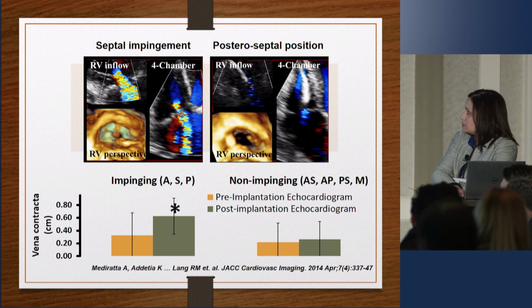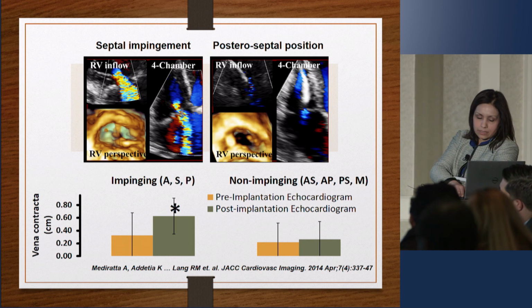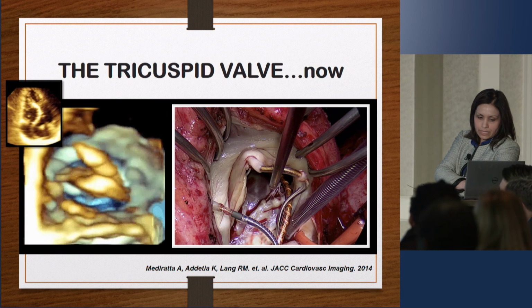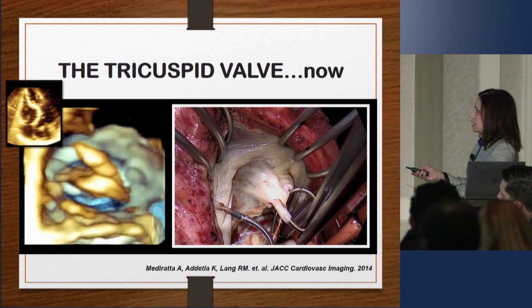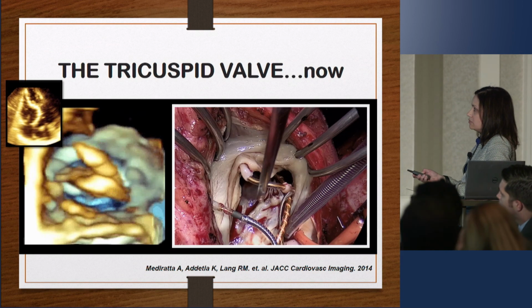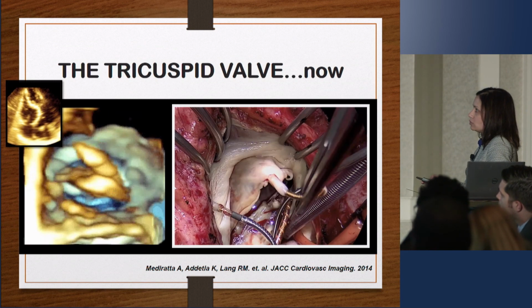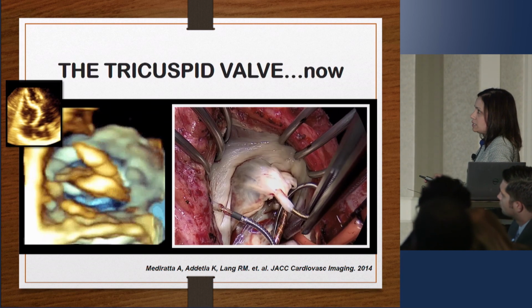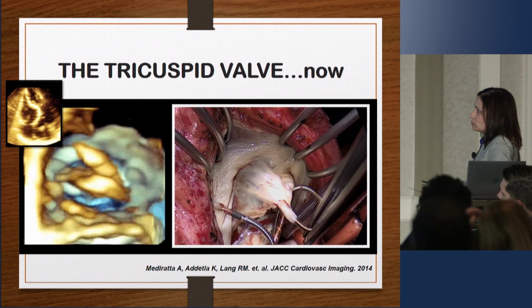And this is interesting because it shows you that 3D echocardiography might have a role to play in deciding on whether a pacemaker is impinging upon a leaflet. So some people don't believe this, and I think we saw a case actually earlier this morning showing that these pacemaker leads can really encase those tricuspid valve leaflets. And this is actually a 40-year-old man who came with right heart failure, severe TR. You can see the course of his pacemaker lead actually on the 3D echo. And then he actually had two leads.